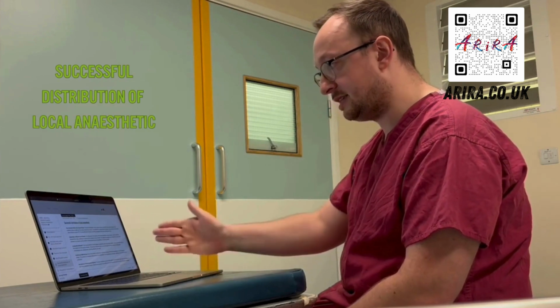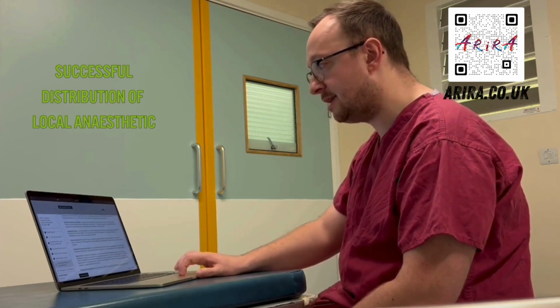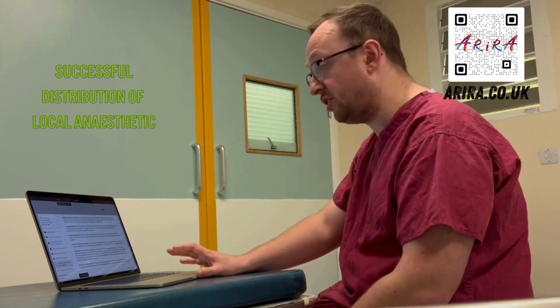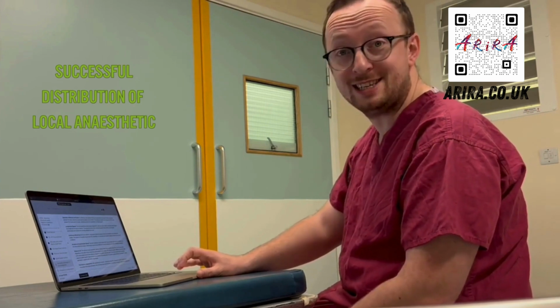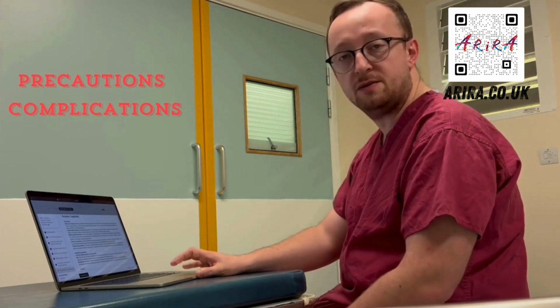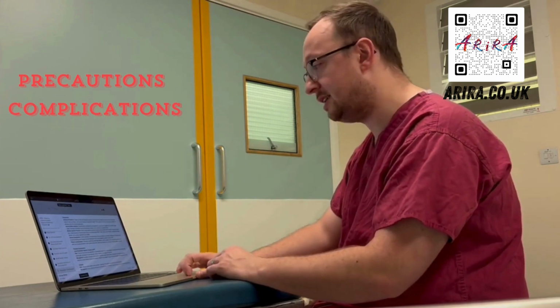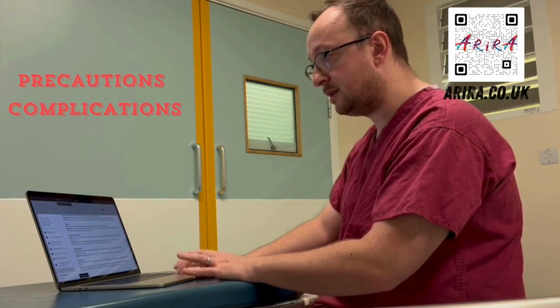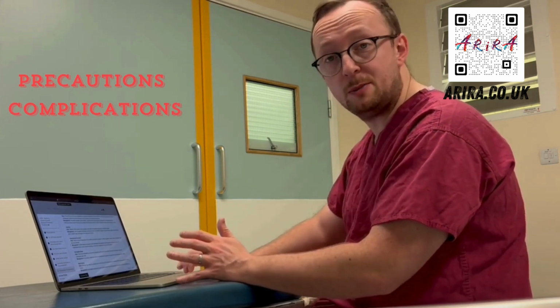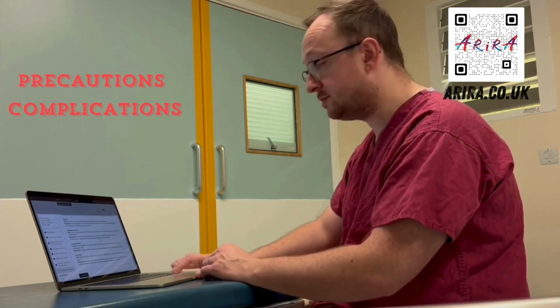So, looking at the successful distribution of local anaesthetic, this is the next one. We're talking about the spreading in the fascial plane, separation of muscle and sheath, the way you're looking for it to spread essentially to increase your chance of a successful block. Here's a list of some precautions and complications. Like anything that we do, there's always some kind of complication that could occur. This is just nicely organised in a way that's really easy and simple to read. What's nice about this as well is, with the complications that can occur, it gives you a brief summary of how you can manage those complications as well, which is nice. Again, that's not something I've seen in a lot of other regional block teaching platforms.